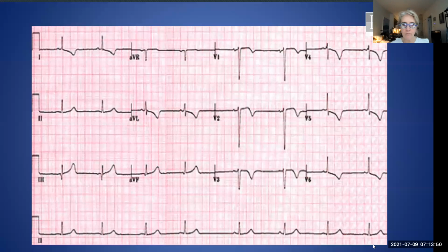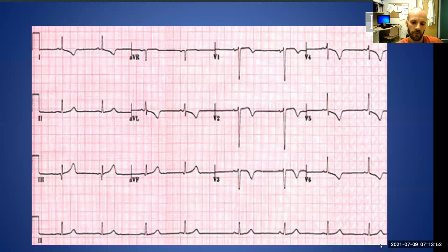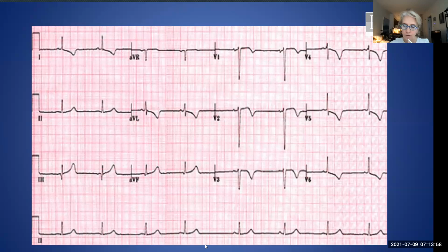Irregularly irregular. Okay. And why do you think it's irregularly irregular? Yep, I'd agree that there is one early beat here. I completely agree. There's also hyperacute T waves in lead 3. Okay, yeah, they're quite pointy in lead 3. Yep, you're absolutely right. Very good.